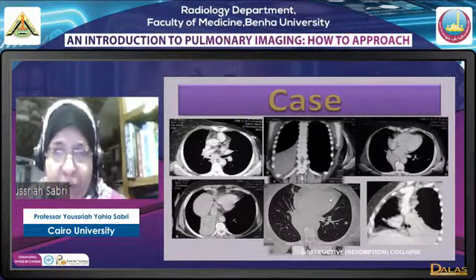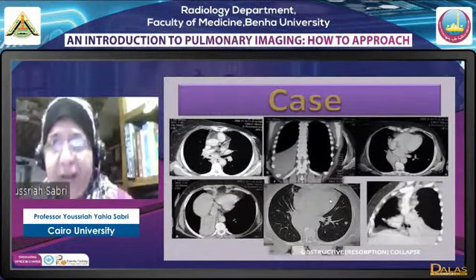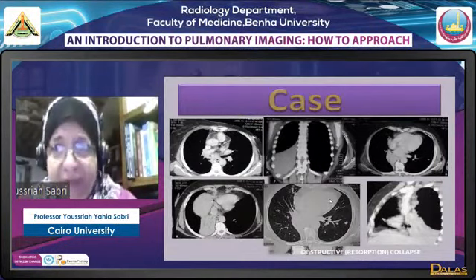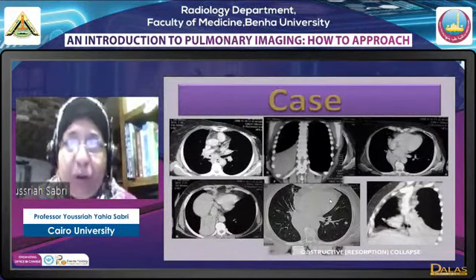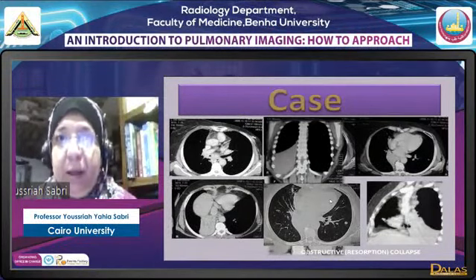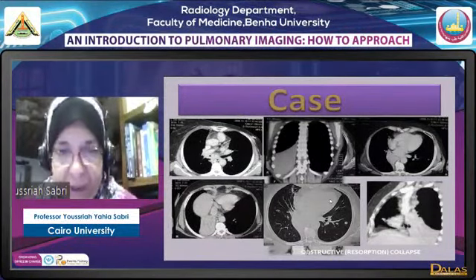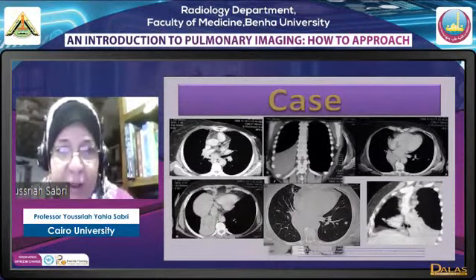Obstructive or resorptive collapse. So now we have seen cicatricial collapse, due to fibrosis, which has a very special pattern. And we have seen the relaxation collapse, where there is massive pneumothorax or massive effusion, something causing compression and relaxation of the lung. And we diagnose it by the effusion being the hero, because we see shift of the mediastinum. Then the obstructive or resorptive collapse.